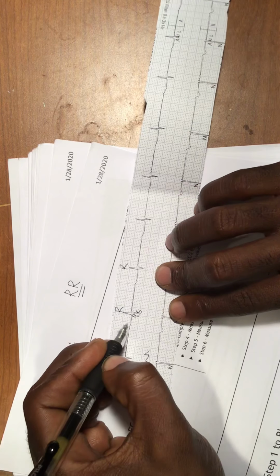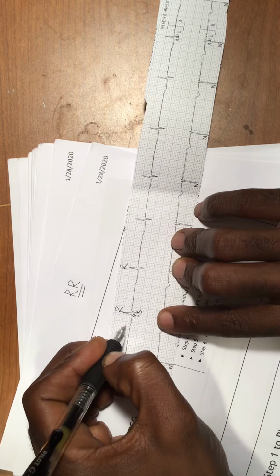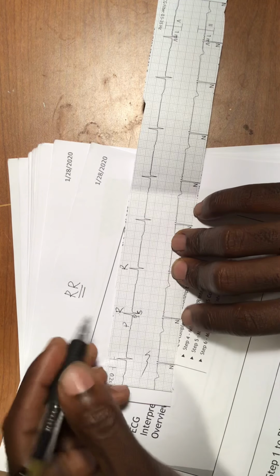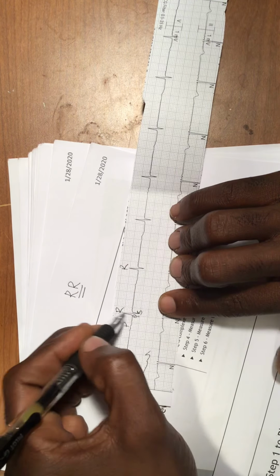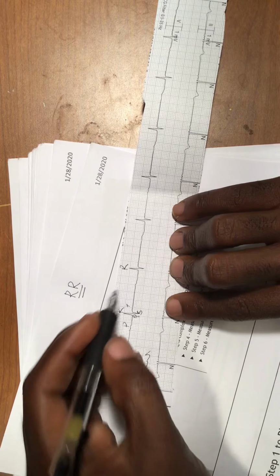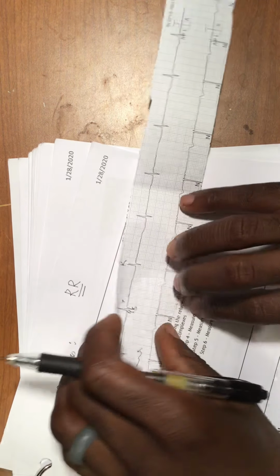So this is very important. And you have your P right here, if you can see it with me, but it's not really upright. You have your P right here. So P, Q, R, and this is P, Q, R, S, T right here. You don't see it very well, but this is where it is. And here we have the PR interval. This is very important. Okay, let's go to our lessons.